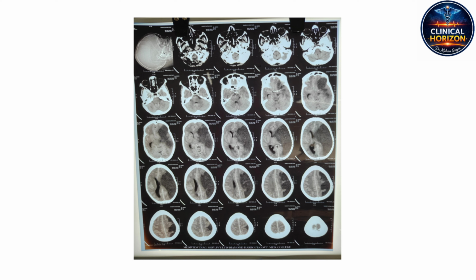The MCA. It's the primary workhorse of the cerebral circulation and overwhelmingly the most common site for major ischemic strokes. So what's causing that dark void? When a thromboembolism occludes the proximal MCA, a vast swath of the hemisphere is immediately subjected to profound hypoxia. The cells fail to maintain their osmotic gradients. They start taking on water. Exactly, leading to rapid intracellular swelling or cytotoxic edema. That dying swollen tissue is exactly what registers as that dark hypodense void on the CT.